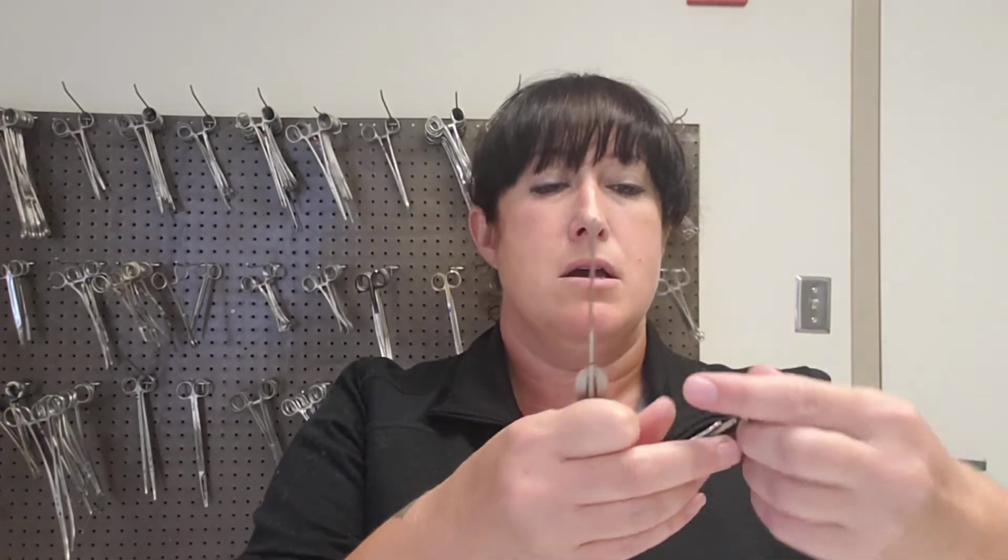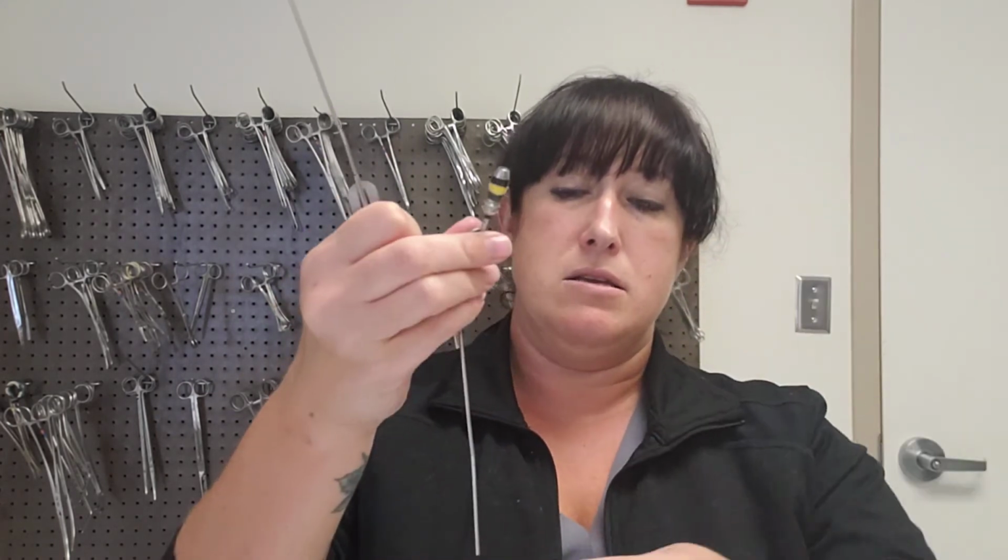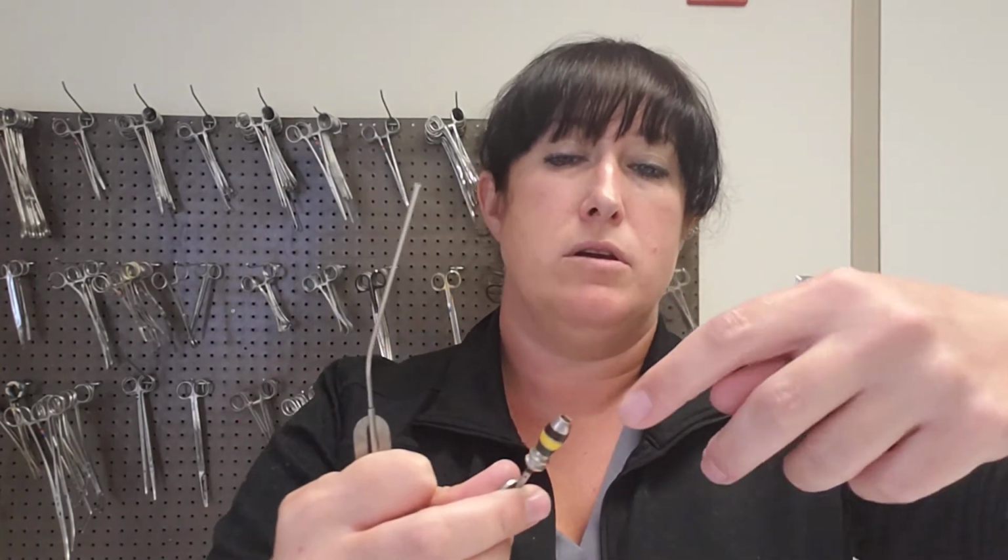Another thing you could do is fill up, of course everything's got to be sterile because this is intraoperatively in the middle of the case. You can take a syringe, and you're always supposed to have saline or water on your back table, and you can draw up some of that and then put your hand over this hole. And then you're always going to have extra buckets on your back table too. What you can do is take that syringe and carefully push it through, and it'll also push through any debris. So there's two different options there for cleaning these.